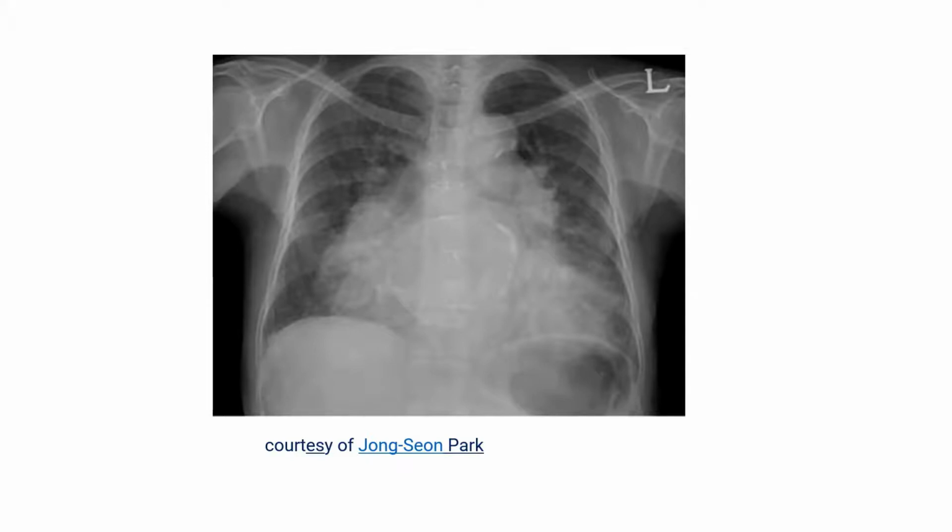And I just remind you one more time that the left atrium and the right ventricle make no border in the heart silhouette, or share no borders. So you don't see them, unless sometimes when they are large, they manifest in a special way. That is the PA chest X-ray. But in the lateral, you can see the RV and you can see the left atrium, as we have seen. So this one here is left atrial wall calcification.